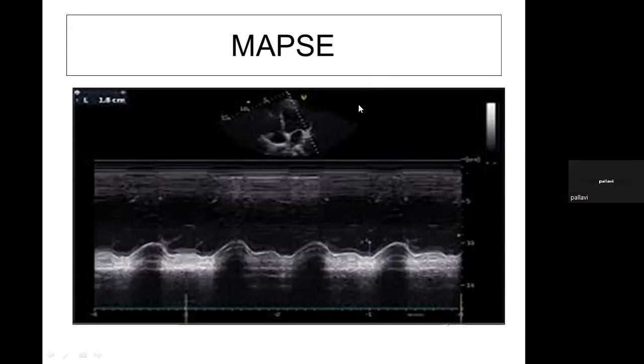I wanted to ask about the sequence in which we should do it. If you measure LV contractility function, should we always do EPSS and then quantify? Is there a method of LV systolic function always by ejection fraction in 2022? In this year of 2022, by ejection fraction only, that is biplane ejection fraction. I'll be showing you in a couple of minutes. Sequence: we don't do EPSS today. Cavity at parasternal long axis view, we straightaway go to ejection fraction in today's circumstances.